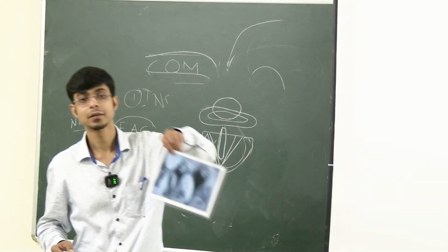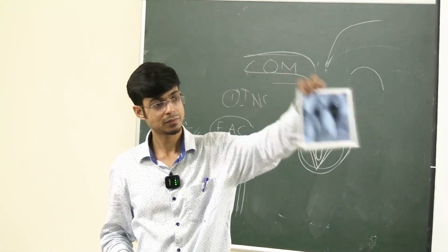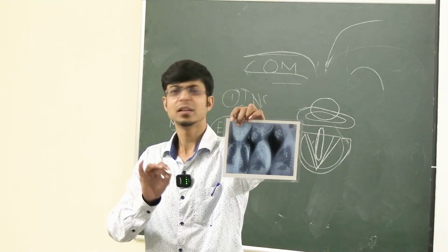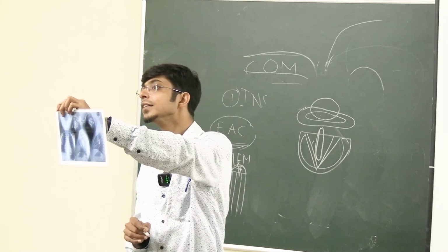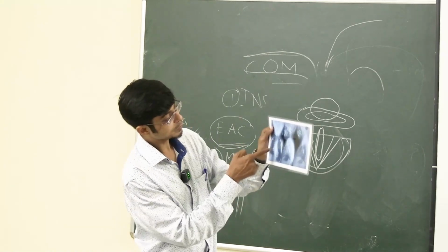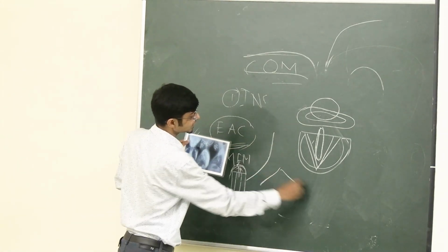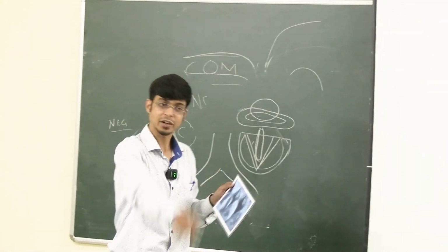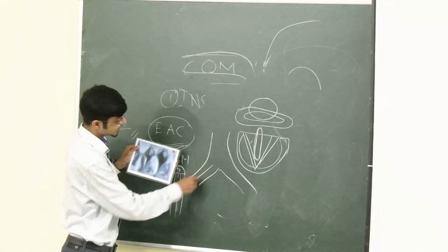See this one. What is the difference between the previous coin X-ray and this one? Whatever. Foreign body তো দুটোই. Exactly. So that is the difference. This is a foreign body in the bronchus. Why are you saying it? Because when we are seeing the AP X-ray, it's lateral. It's going lateral. So the trachea is like this after the carina. ওটা carina হতে পারে, carina উপরে হতে পারে, anywhere. Okay, but this has gone into the bronchus. That's why it is like this.